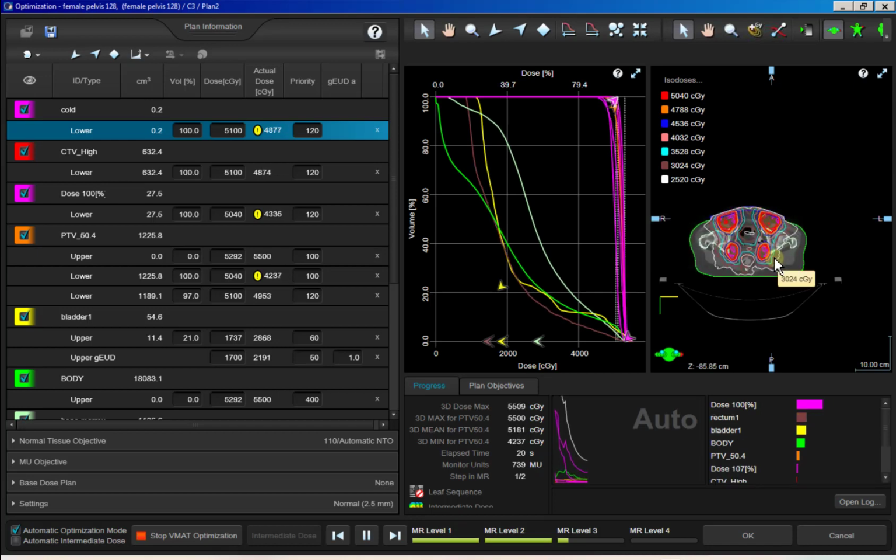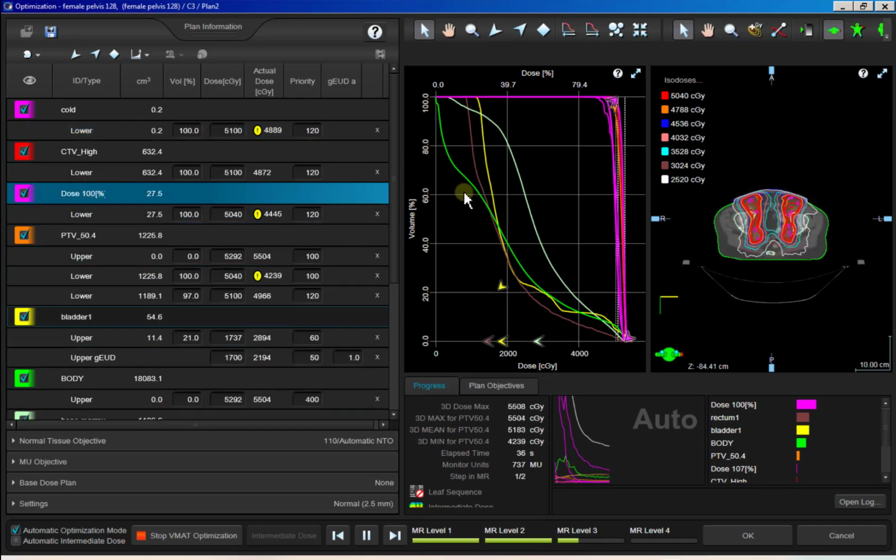It's also valid to think about your collimator angles and your beams. You know, if you got all these cold spots and you run it a second time with these extra contours and constraints in these cold contours, hot contours, and you just don't see much improvement, maybe we need to add that third arc. Just because it looked good in level 1 doesn't mean it's really going to produce a good plan in the end. So you just always got to be thinking about the whole picture, right, start to finish, and what you can do to improve your plan.